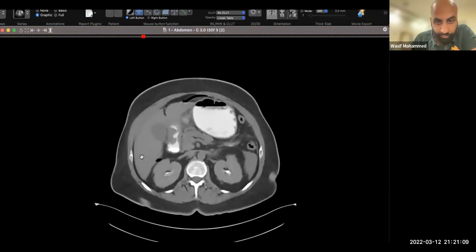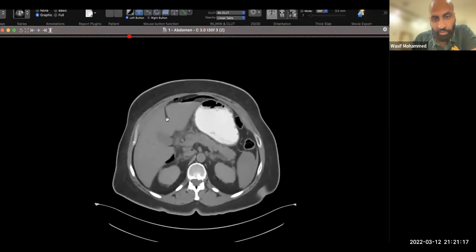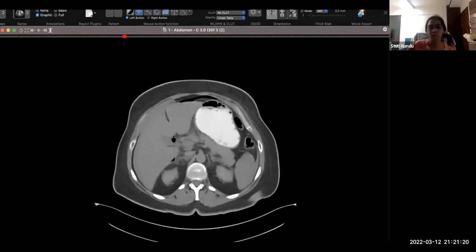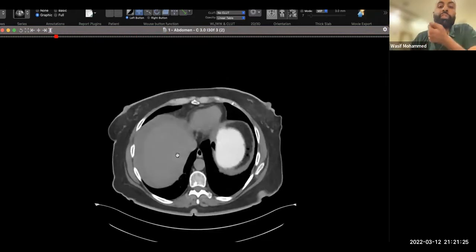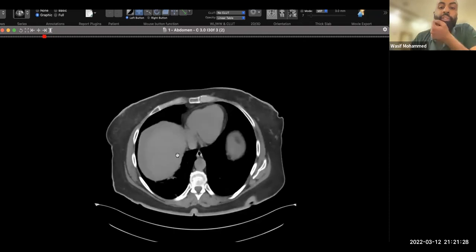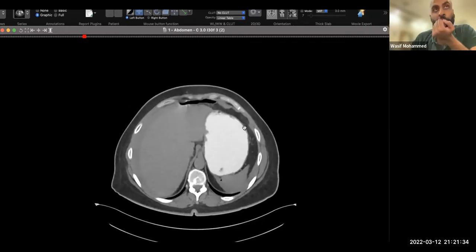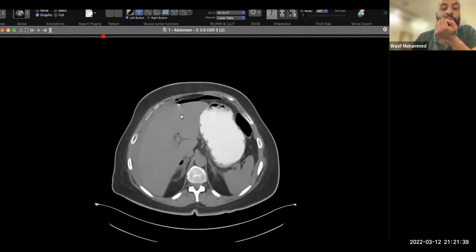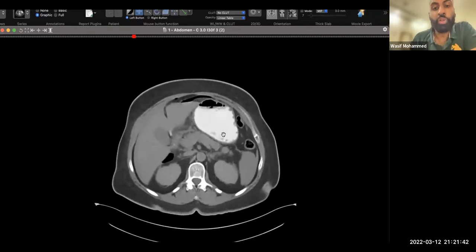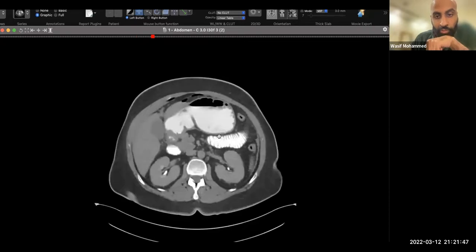And this is the second part of the duodenum, not the third. You can see it's going out exactly into the falciform ligament area, and then you have your air bubbles here. So when a CT is given to you immediately after an X-ray, you need to say, okay, these are the CT images of the same patient which confirm what you wanted to initially evaluate on the X-ray. So you need to stress that it confirms a pneumoperitoneum. It also shows a lot of free fluid, and I'm looking at the possible sites of the perforation.